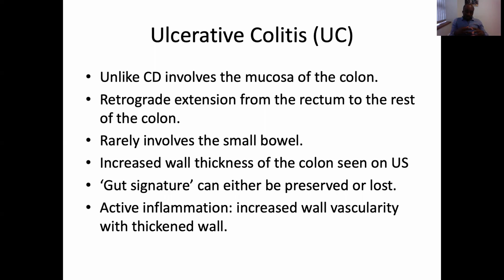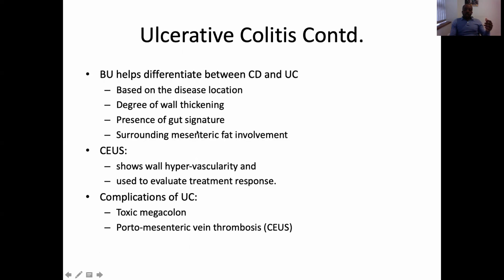And in active inflammation, you tend to have increased wall vascularity with a thickened wall. Usually you shouldn't have much vascularity in the wall of the bowel, of the large bowel in particular. But in an active inflammation, you have increased wall vascularity and a thickened wall.